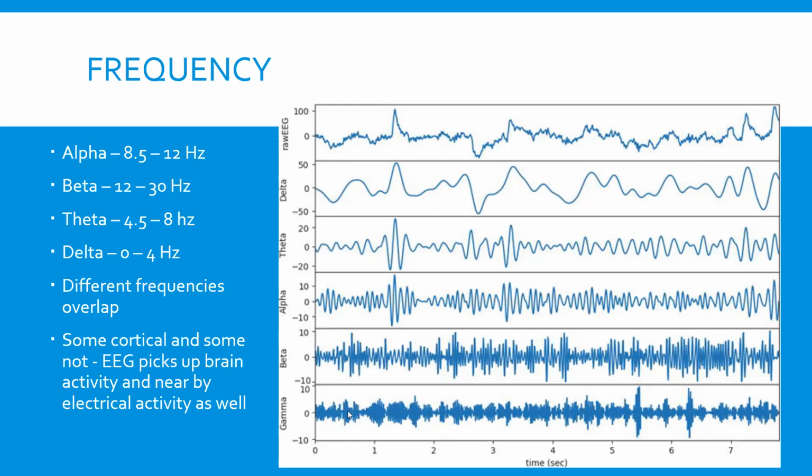When we're recording EEG, this is a raw recording, directly from the brain. It's usually not one frequency separated, it's usually not beautiful like this. It's usually multiple frequencies layered on top of each other. So you can see there's some delta, and then in between, do you see how this fuzzy stuff is the gamma and the beta. So this is a raw EEG that's not processed.